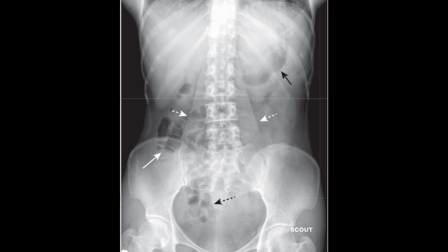Conventional radiography does not always allow us to make the precise diagnosis, but the good thing is it allows us to screen a big number of people in a very short time and at least to suspect their pathology and order them additional examinations, if any. So it's better to know how the normal abdomen looks like.